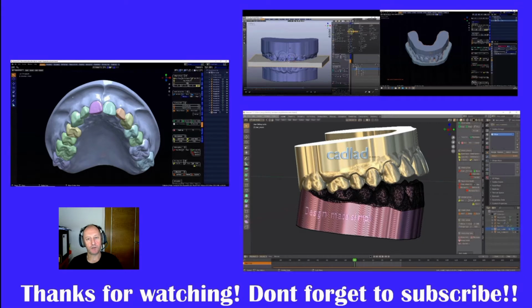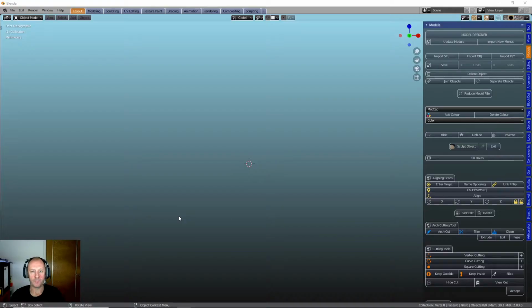Today, I just want to do a short video on the study models and creating a set of study models within Blender4Dental. This is all within the model module, so it's easily accessible and a relatively straightforward part of the model module. So what we're going to do first is bring into the scene a set of models that I've prepared earlier, just to speed things up a little bit.